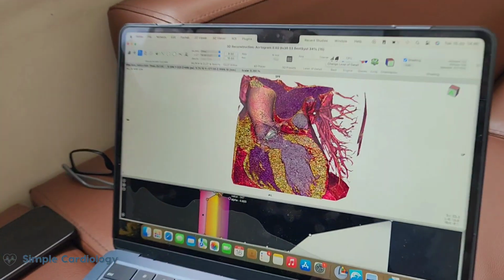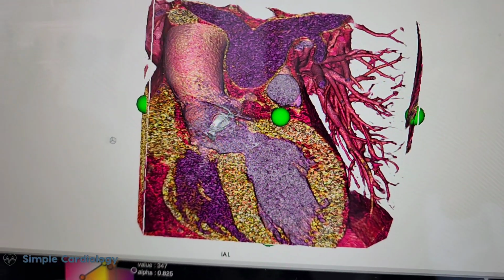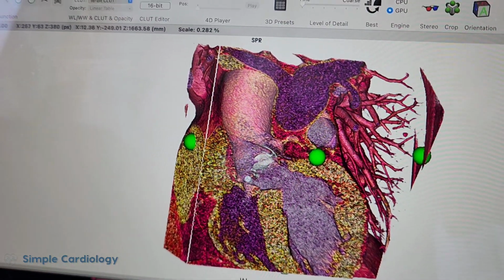Of late, he has developed new symptoms of breathlessness on mild exertion and weight loss. The CT scan was done to analyze the paravalvular leak this time, and we found something unique. If you look at the CT scan of this patient, this is the paravalvular leak.